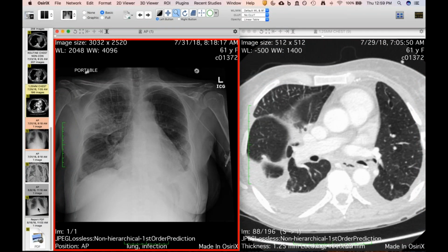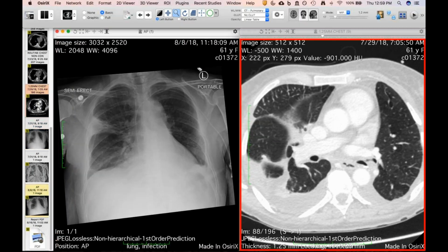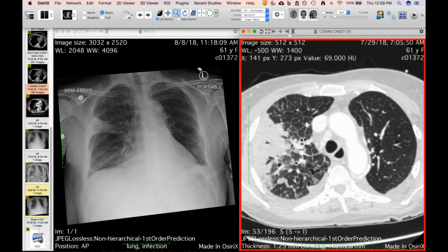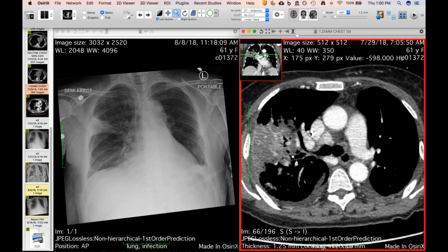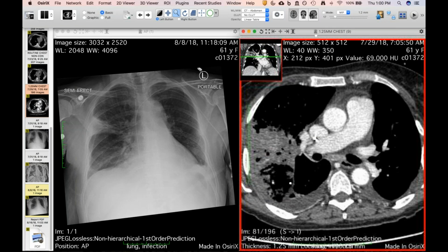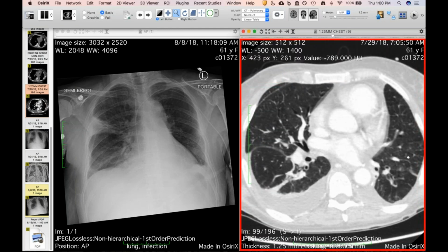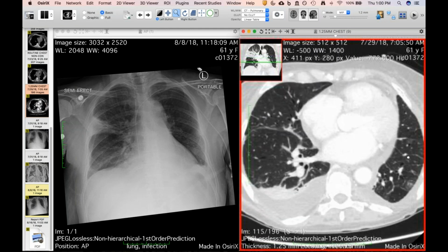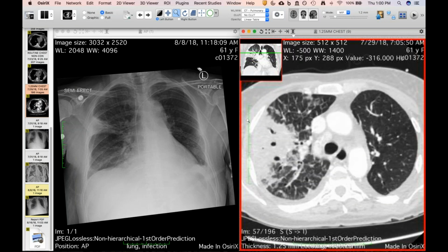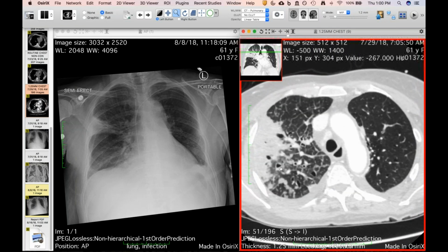But by a week later, this whole area has substantially improved. So I don't know. You think this is asymmetric edema? Her pulmonary veins weren't compromised in this area, and she had just effusions elsewhere, but no other areas. Maybe a little bit of septal thickening on the left, and not really much in the right lower lobe. But I don't know. How would you explain this appearance?